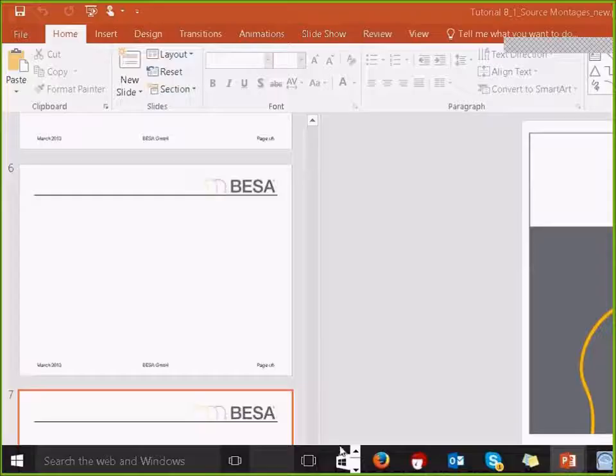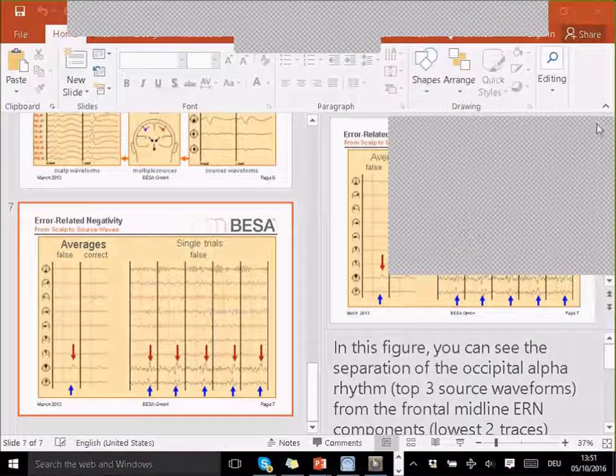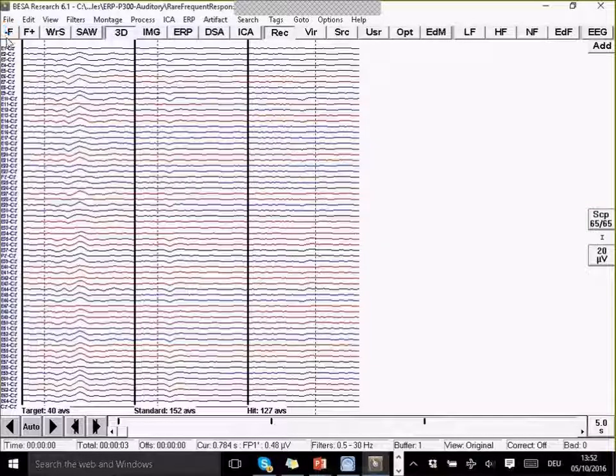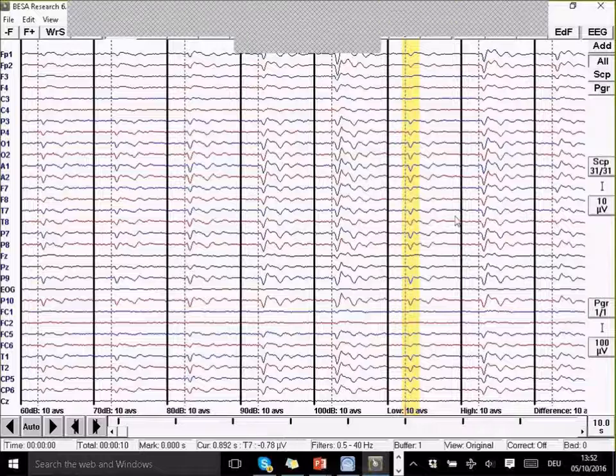Yeah, and let's try this for some data. I will now load a data set to demonstrate this. And for the moment, we're just going to start again with our all subjects file, which I've still got in my memory here.